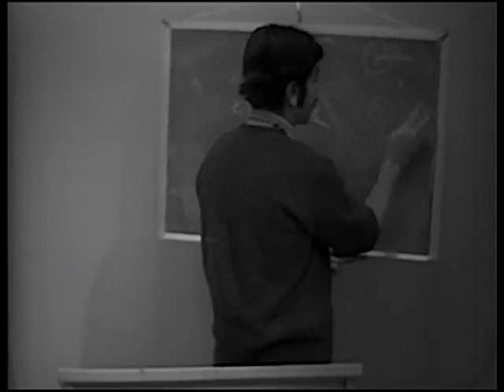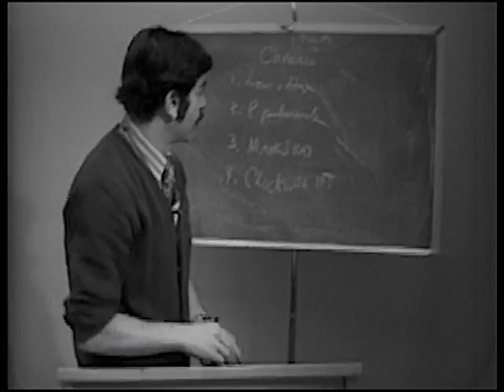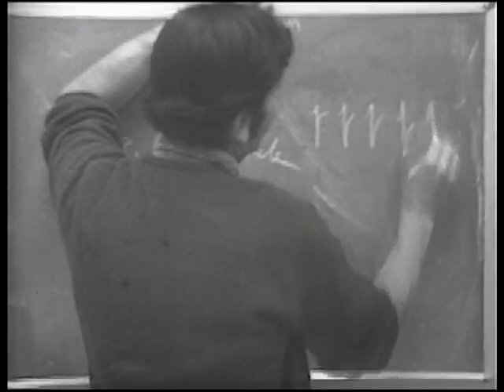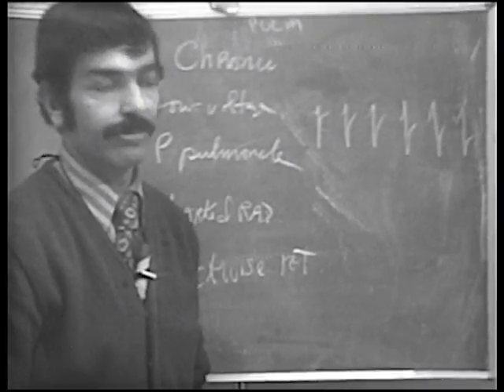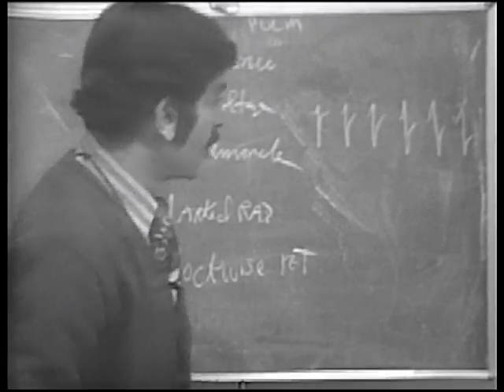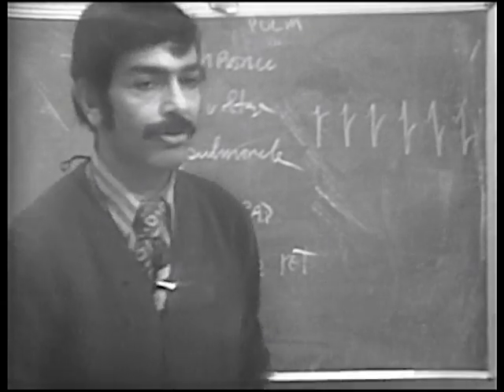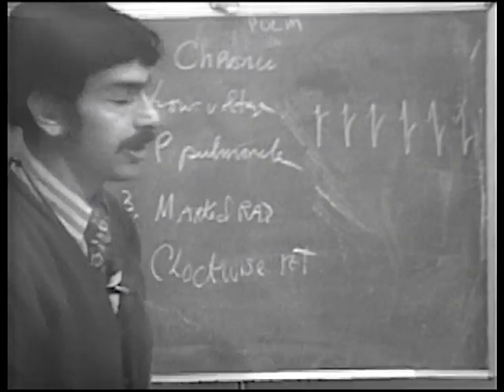So that would be clockwise rotation. What this EKG looks like very frequently is you look at V1, V2, V3, V4, V5, V6. In other words, there's very poor progression of the R wave as you go across the precordium. And you might even be thinking a little bit of, well, does he have an anterior infarction, right? You might also be thinking of right ventricular hypertrophy, right? Because this R/S ratio is incorrect. The S wave is too deep. So you say, maybe right ventricular hypertrophy, but you look over at V1 and you don't see a tall R wave.